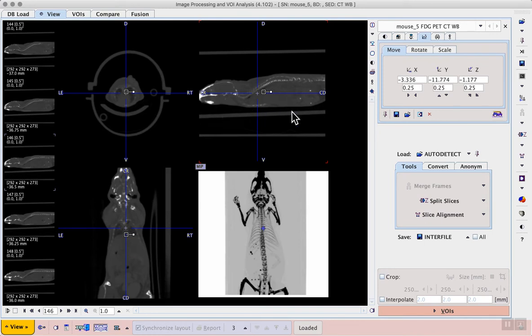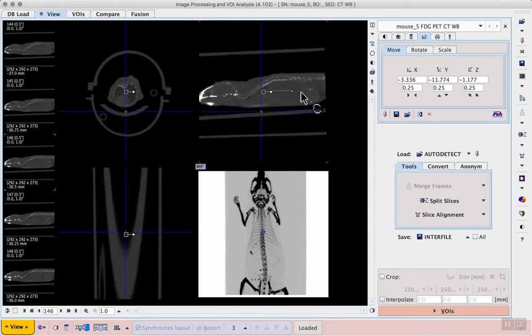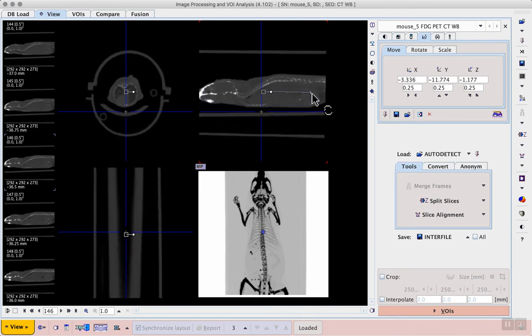And then, based on this lower bed right below the animal, we can triangulate a location that allows us to see how parallel that bed is to our cursor line, and then with the smaller solid square on our reslicing handle, we have rotation controls. Again, I can left click and hold. I can then extend that handle, and I can rotate the animal on a plane by plane basis to bring that bed approximately parallel with the cursor line through my image.